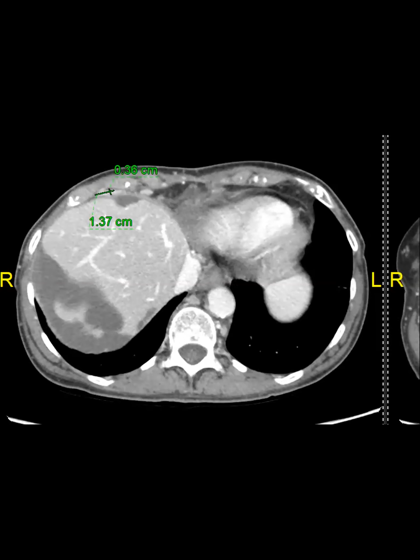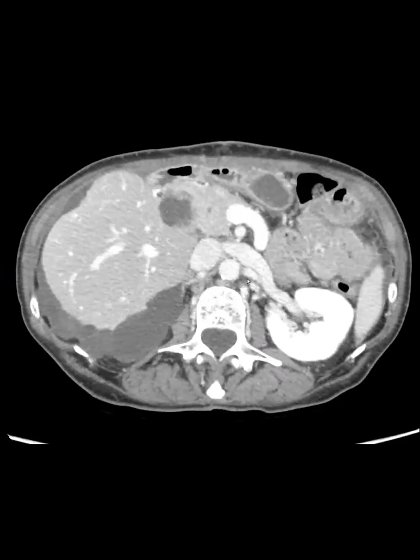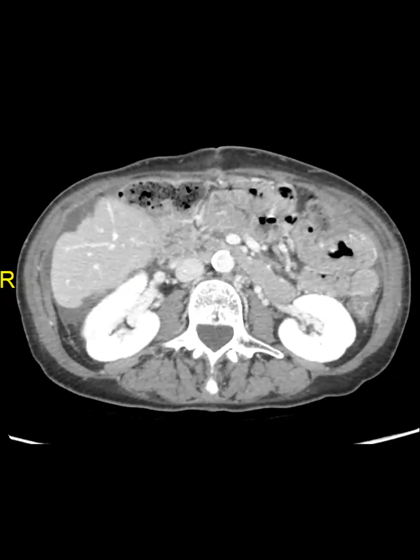peritoneum. God, why can't I say it? Mucinous. Aarti, help me out. Pseudomyxoma peritonei, yes, which is now called DPAM, or disseminated peritoneal adenomucinosis. Right. So you can see that. Really? There's a new name for it? There's always a new name for stuff.